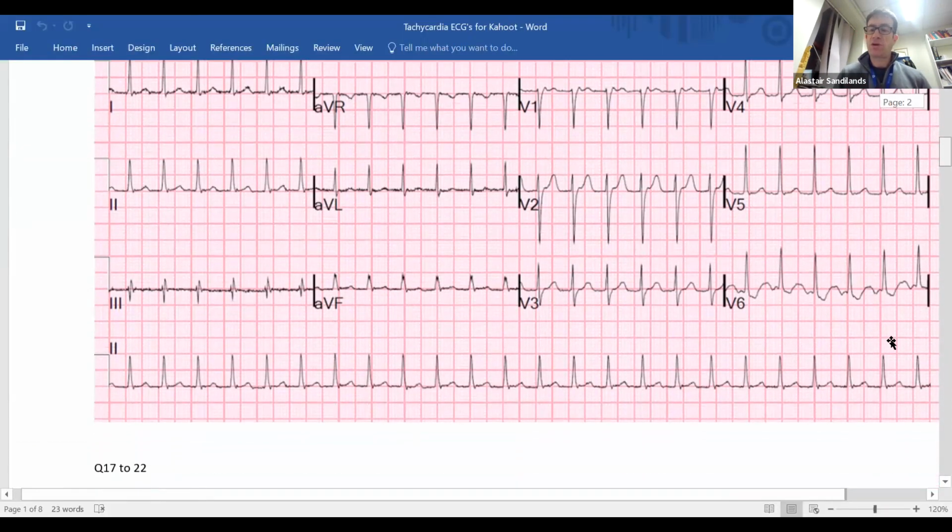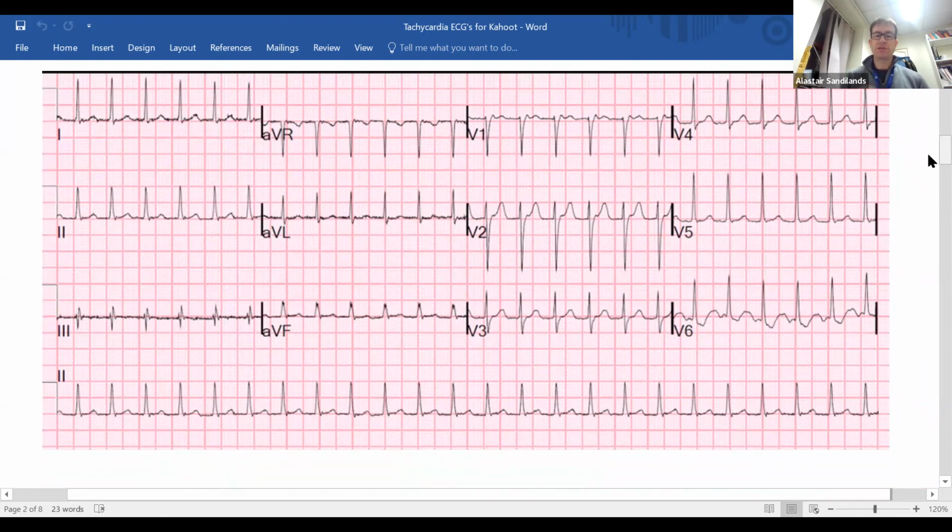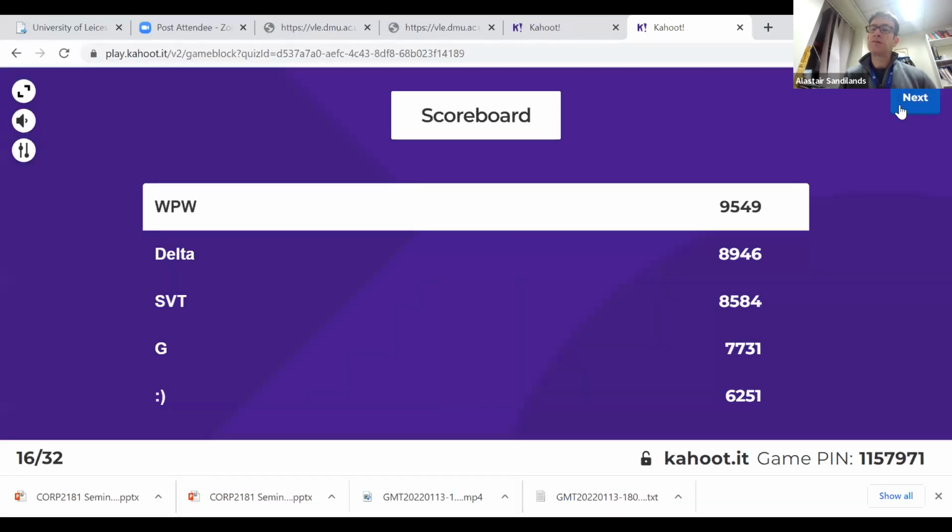Okay, so question 17 to 22. I'll give you some time to look at this one. 17 to 22.